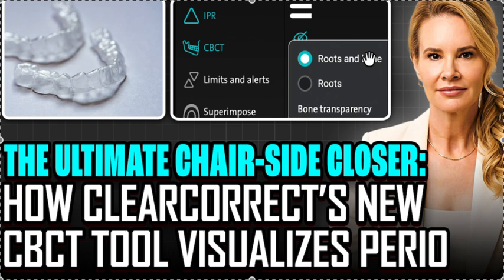But this was pre-Straumann. But anyways, if this is incorrect, by all means, I've been very transparent with Straumann, like, hey, tell me what's going on. Have someone reach out to me, say, hey, this is something new. But they don't reach out to me. Nor do they answer questions. So this is all that I know. If you guys know something different, let me know. But I think that if you use your brain, you can learn to use this feature in ClearCorrect. It's just not going to be something that's going to be very useful for your patients. So you're going to then have to translate it, which is the hard part, is the translation. That's the part we're missing here.